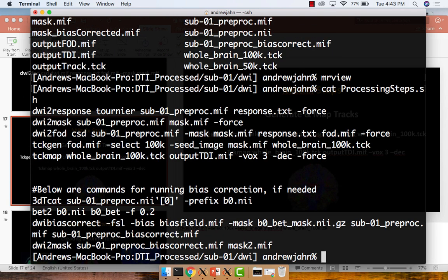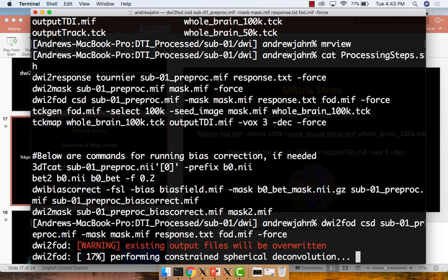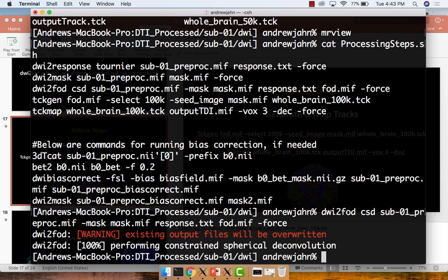Notice that I'm not doing anatomically constrained tractography. This is something that John alluded to earlier. So during this part of it, if you wanted to, you could provide a command which inputs these different tissue types that you have in your brain so that this knows where those tissue types are, and it will try to generate more biologically plausible tract orientations.